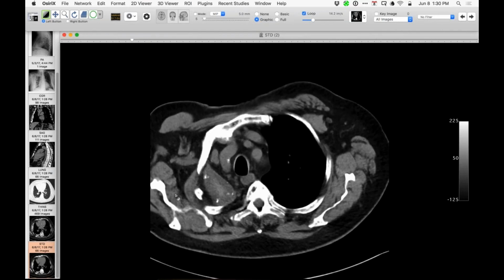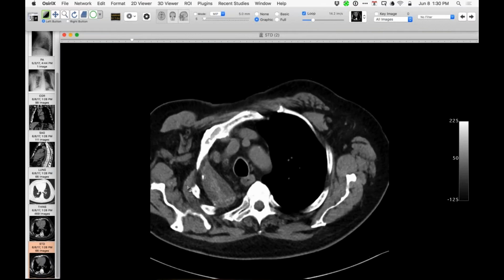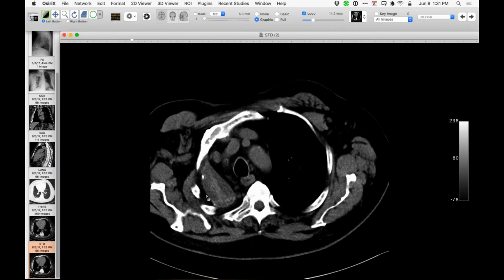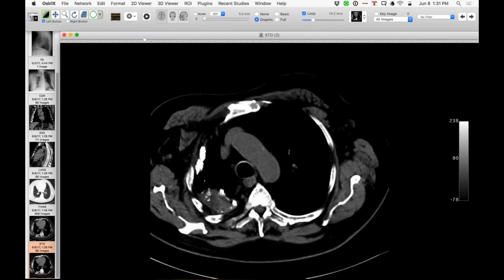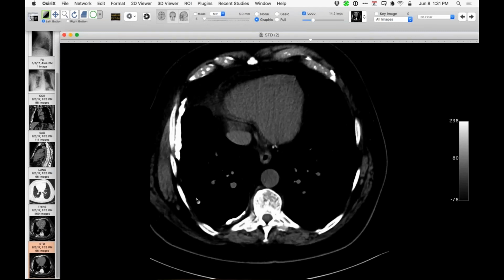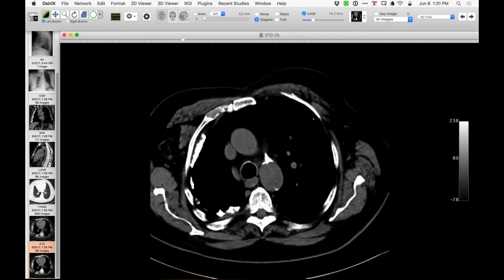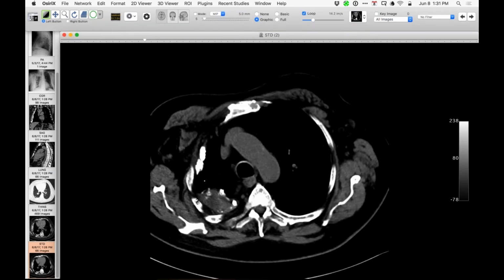It isn't pure fat like an oleothorax, although I'm not quite sure what an oleothorax would look like if it was very chronic, or whether this is a hematoma, a pleural space hematoma, because he had a pneumothorax induced for the treatment and it filled with blood. I don't quite know what this is up here, but I thought it was very interesting otherwise. So, a very extensive calcified fibrothorax with a history of TB and treatment of TB, maybe including something like a pneumothorax.